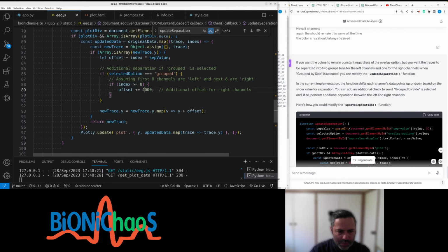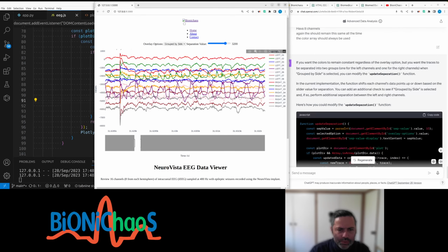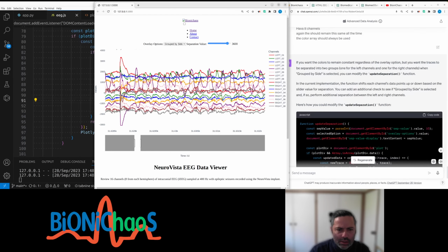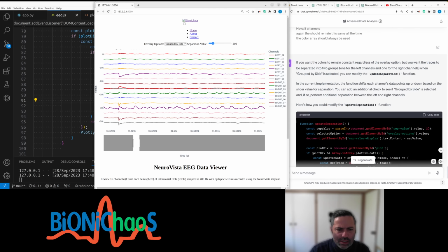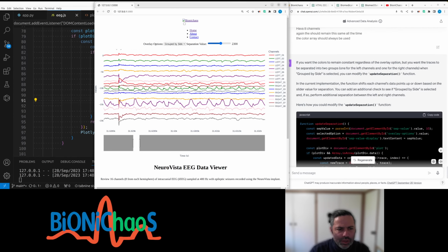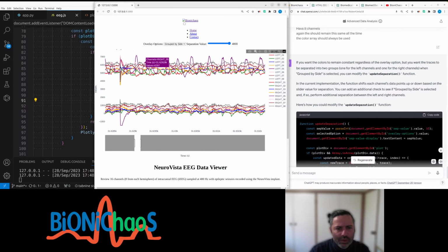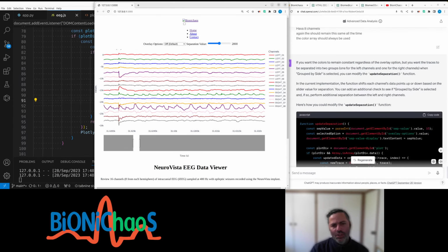Yes, this number should be much larger, like 10,000 or so, and also, yeah, when we do group by side, wait a second, to understand how these numbers work, so if 2000 you have 0, then 4000, it's not changing back. No, it is changing back but not refreshing.